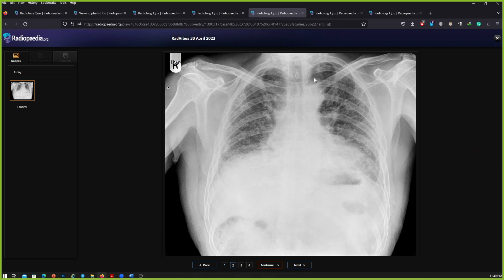There are some cystic lucencies as well, which are more pronounced along the middle and the lower lung zones. Bilateral costophrenic angles are a bit hazy, which is most likely due to atelectasis and the fibrotic changes. However, I can't see any free air in the lung apices or under the diaphragm. I would like to know about the history of this patient related to occupational exposure. There's no previous occupational exposure. The patient has chronic cough for the last 1 year, which is deteriorating gradually.